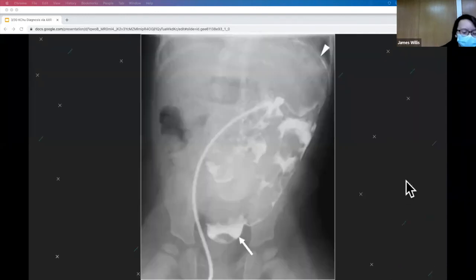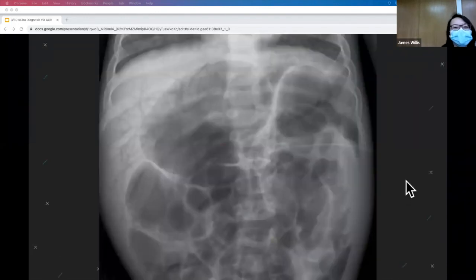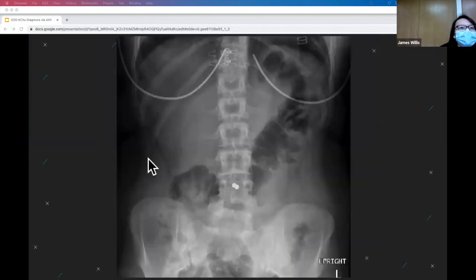Keys. Oops. So tell me what's sort of obvious here. Yeah, there's some sort of obstruction, maybe sepsis. There's some sort of ischemic bowel in the infant. And over here, you see gas in the portal vein as these branching dark lines in the periphery of the liver. For a kid, the most common causes of ischemic bowel are necrotizing enterocolitis or severe abdominal infection, sepsis. Okay, JMAC.